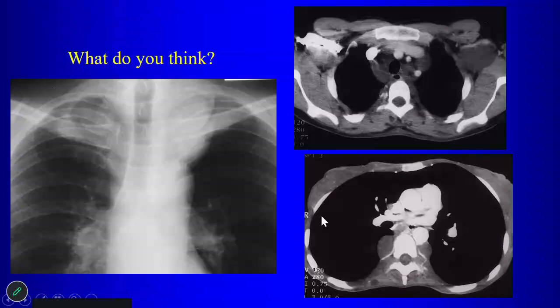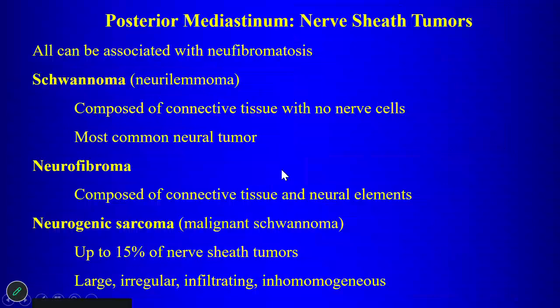Doesn't appear to be actually enhanced. No. Well, you have these masses all through the mediastinum, also here in the axilla, somewhat low in attenuation, and also here, and this is very characteristic, right? What does this patient have? Neurofibromatosis. You have all these neurofibromas. You have bilateral paravertebral masses, and you can also have neurofibromas anywhere with neurofibromatosis. These are in the mediastinum, plexiform neurofibromas there in the axilla.